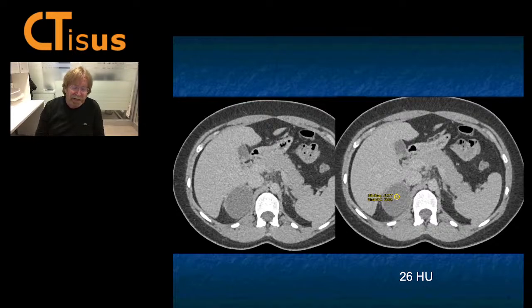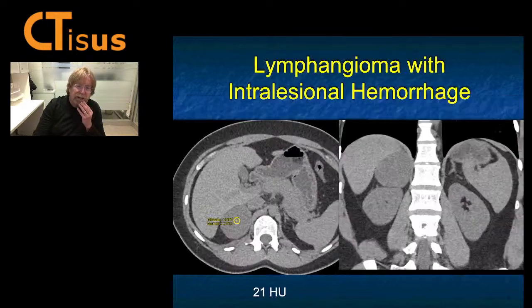I don't know what this lesion is. I would have guessed maybe an adenoma, a typical cyst. But whatever it is, I know it's benign. Lab values were negative. This was resected because the patient was anxious and was a lymphangioma. We always have some unusual adrenal lesions, and I have to say lymphangioma is as unusual as it gets.